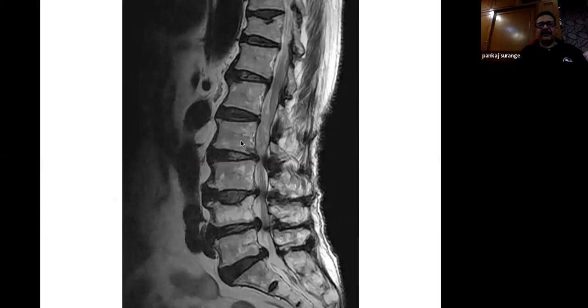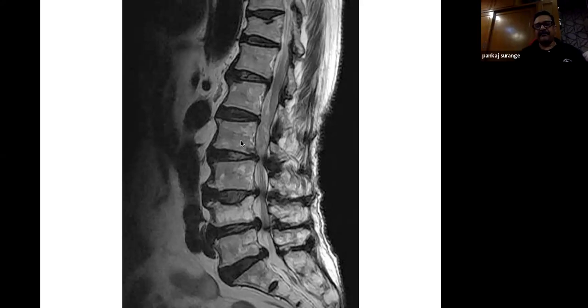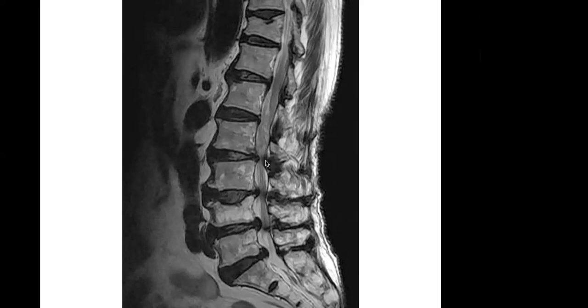This is the MRI of an actual patient who has all the pathologies, whatever pathology you name, it is there. And the patient was totally pain-free here. There was no pain at all in the lumbar spine. Can you make out disc desiccation, vertebral fractures, facet hypertrophy, ligamentum flavum infolding?